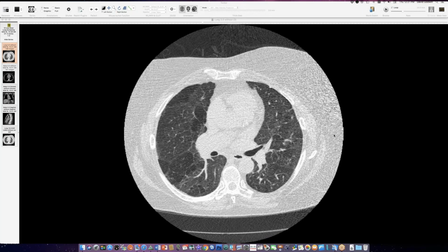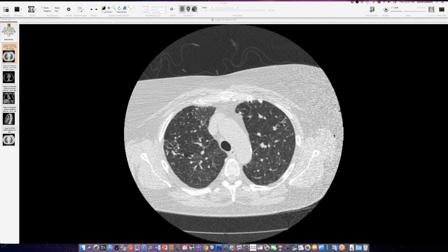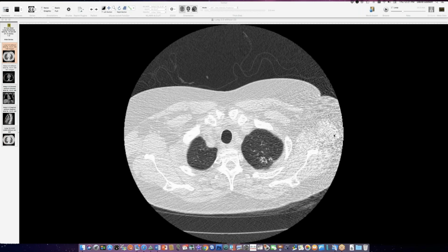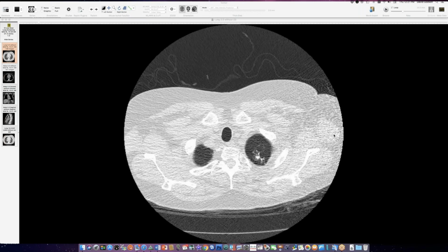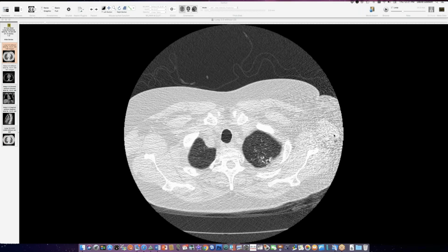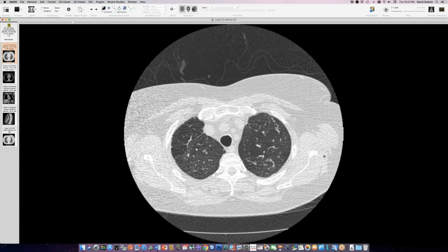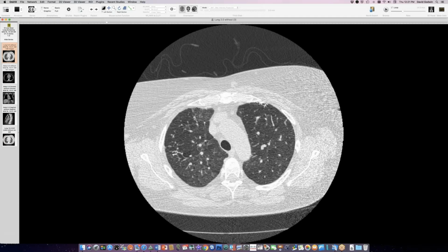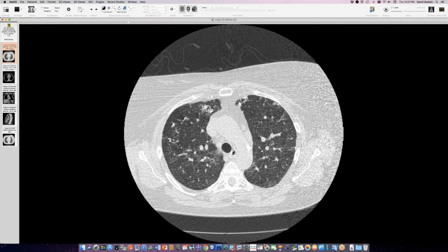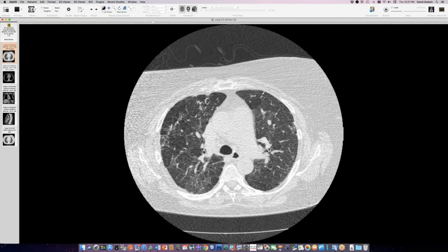So this is a woman who smoked cigarettes, but also worked in construction, a variety of jobs, including, I think, hauling concrete around and stuff like that. And she has these lung calcifications, sort of stringy lung calcifications on both sides with kind of an upper lung concentration, all these little dots. And this is not DPO.